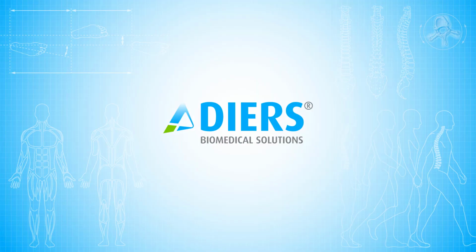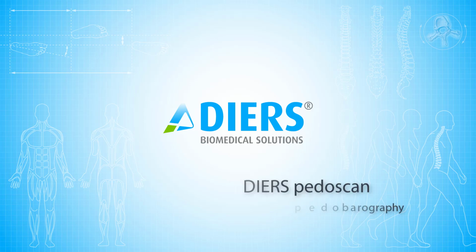Welcome to a new tutorial from DIERS International. In this video we will work together through the result pages of a static foot pressure measurement using the DIERS pedoscan system.